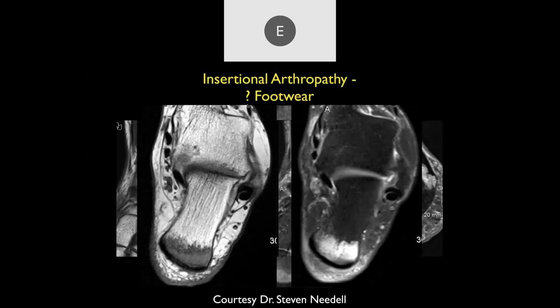And in this case, they believe that this was primarily pressure injury from footwear, chronic footwear in this location.